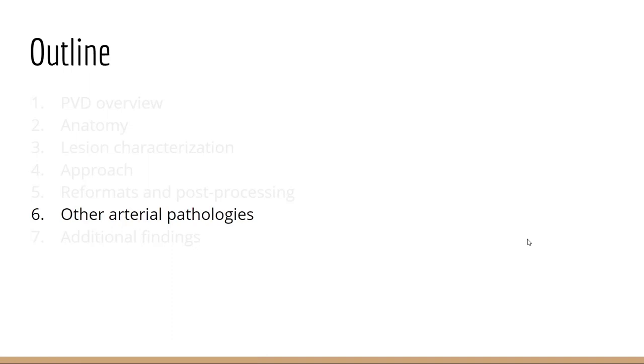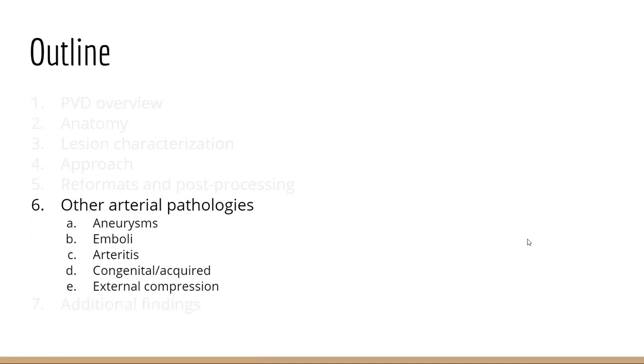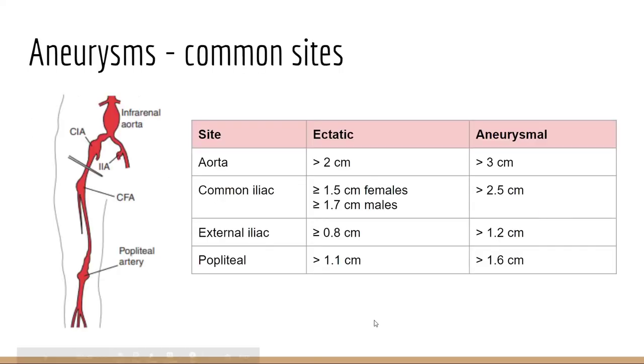So not all runoff studies will reveal simply peripheral vascular disease. There are other pathologies, which I'll be getting into, and particularly emboli. But first, a note on aneurysms.